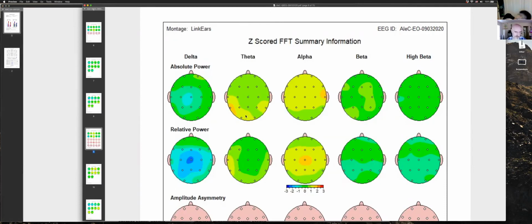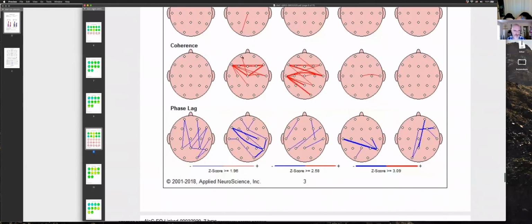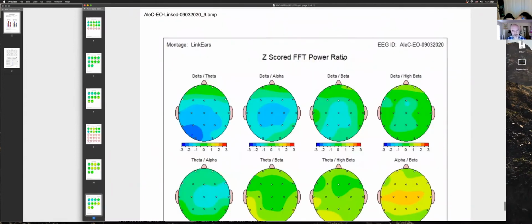That's still fascinating because I'm like a visual learner. Yeah. Well, you can't wake up the brakes, only the gas pedals. Okay. So you can't stop it from switching gears and noticing all this stuff. It's hard to point it in one direction. You also see down here the same kind of perseverative connect, front midline stuff again, the anterior cingulate. Same thing. And then at the end, these are ratios of frequencies.